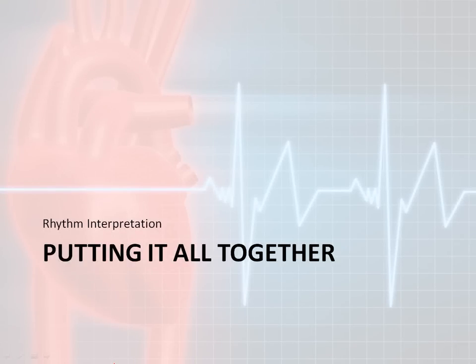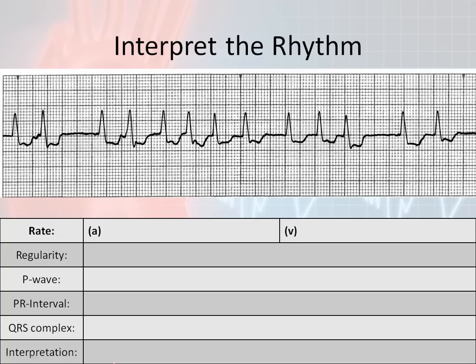Hopefully by this point you haven't been too bored, and we're going to go ahead and try to put all of this together. I'm going to have some rhythm strips now that we're going to go over that you're going to be able to actually look at, and I'm going to write on them so that way you can see what I'm looking at as we go through this. So let's go ahead and put this all together.